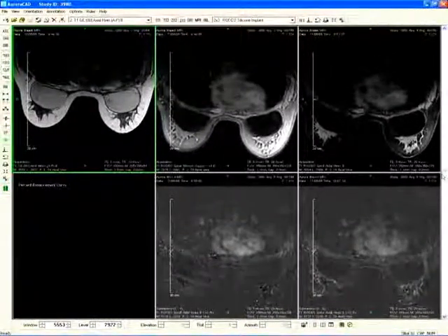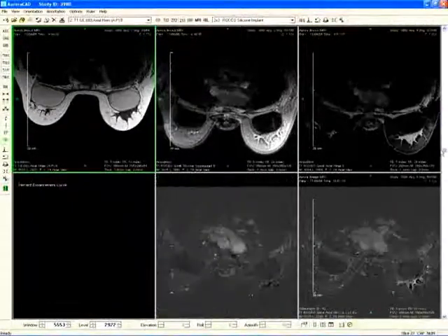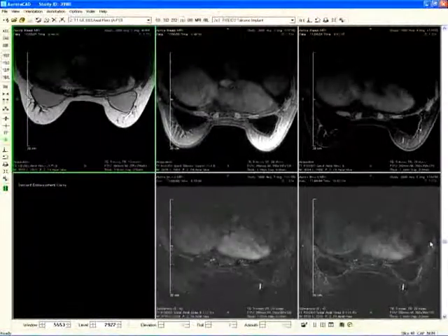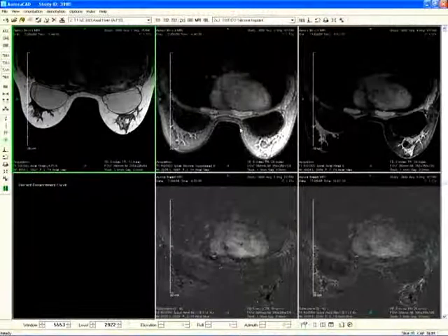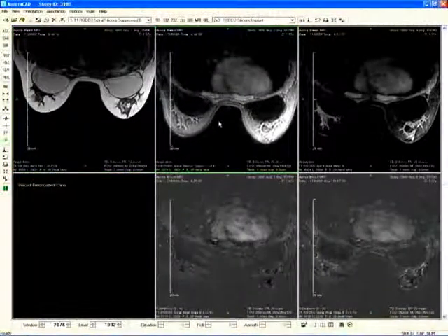The image in the upper left, a T1 weighted gradient echo, is done for the evaluation of the inner parts of the implant. This specifically looks for intracapsular rupture. If present, the linguini effect can be clearly seen within the implant.